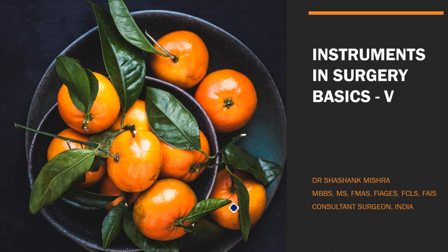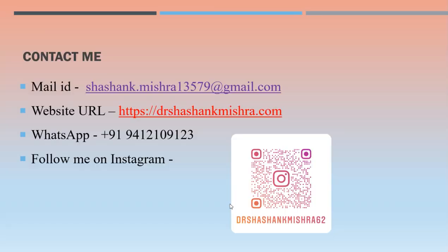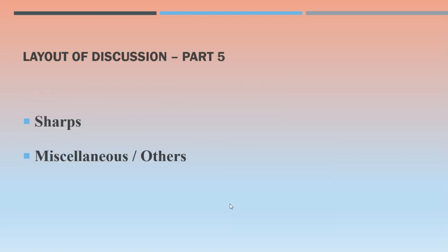In this video, in continuation of instruments used in surgery, this is the fifth video regarding the instruments, and we are going to cover in this video the various sharps instruments, having a sharp border, usually used for cutting purposes, and either for cutting or sometimes for stitching, and some other instruments coming under miscellaneous groups.